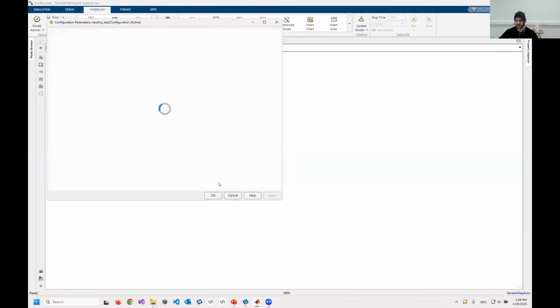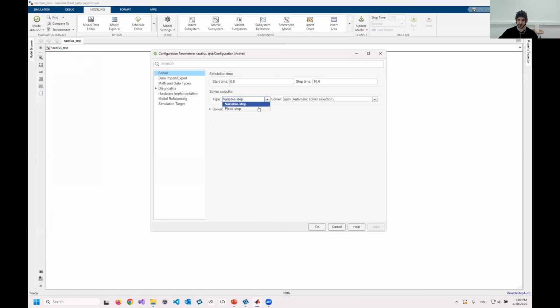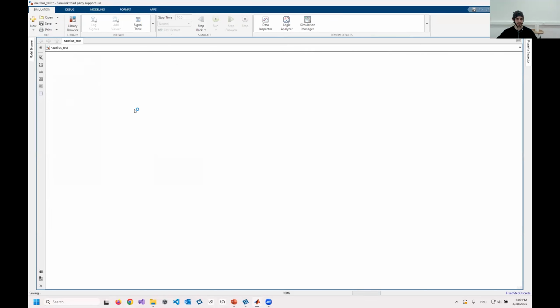The Nautilus that I've set up right now will be recording with a sampling rate of 250 Hertz, so I set the model to a fixed time rate of 250 Hertz. This is important for setting up filters correctly, because they have to know the frame rate of the device.